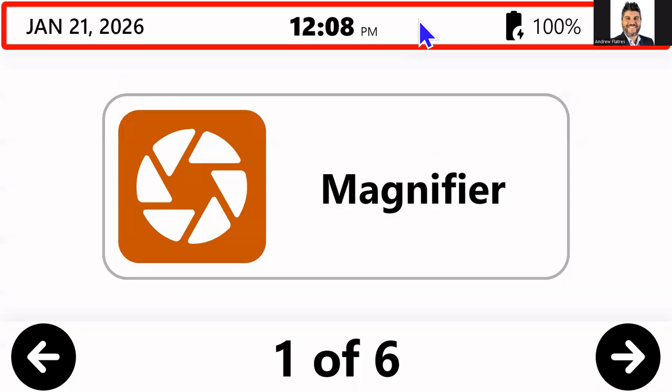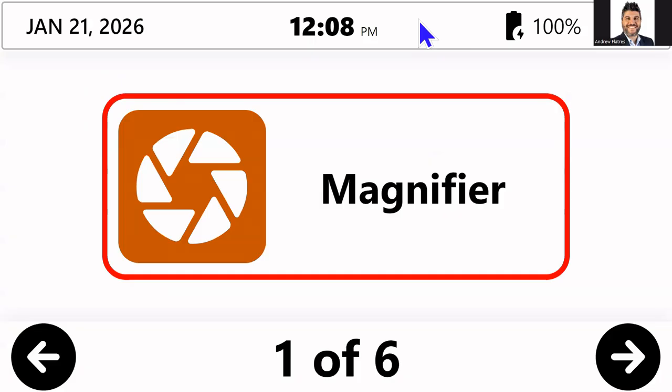Thank you. Okay, so I have Prodigy installed on my laptop PC right now, and I have a red locator bar that's encircling the header bar that includes the date, the time, my battery status, and my Wi-Fi status is connected to the far right corner there. In the center of the screen, I'll tab. Everything is tabbable as well as touch and keyboard navigable, as well as a mouse. So you see my mouse arrow there. I have mine in blue, a little bit enlarged, that I moved around there briefly.